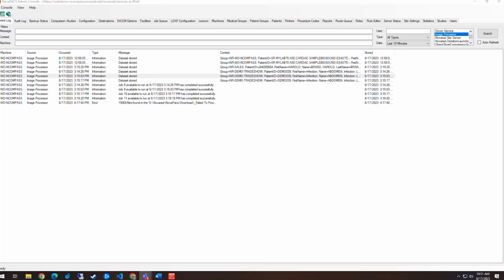So to answer your question, Rachel, sorry, I just noticed that about the DICOM options. Yeah, the name in DICOM options is whatever is logical to you. If it's a reading group, whatever is going to, when somebody looks at it, let them know what that destination is. That name field is whatever you want it to be. The AE title, the port, and the IP address have to be very specific, but the name can be whatever makes sense to you guys.